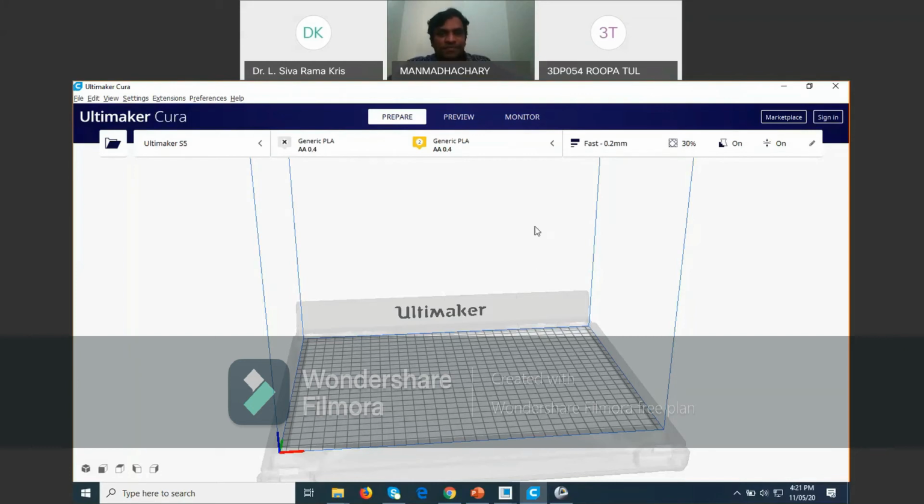Yes. Here, just here in the top left, you can see here.